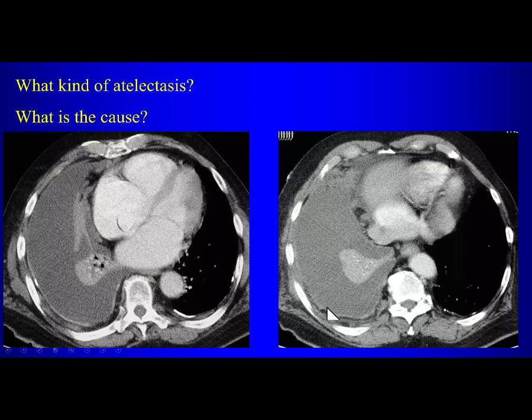I mean, the pleura is thickened here, yeah, but in this area over here, there's too much soft tissue. And it also looks like there's some thickening extending medially, but there's just too much soft tissue here.